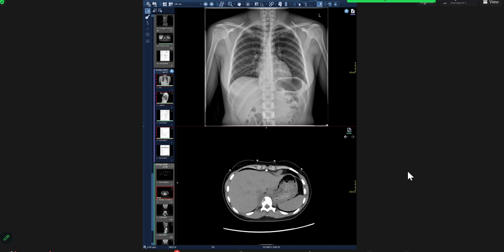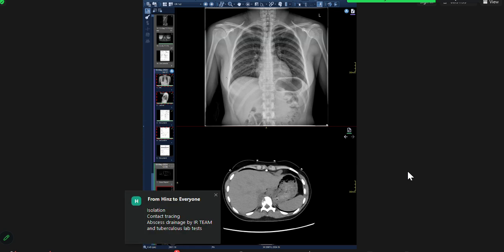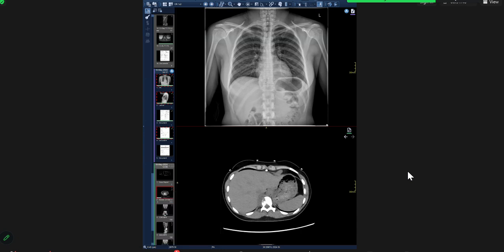And then you said a very, very nice thing, which I liked a lot, that you at once thought about extramedullary hematopoiesis. You told me that the bones look normal, and you're not thinking that it's extramedullary hematopoiesis, which is a very good negative point. That is how you have to treat it. So think about these paravertebral things and what the 3 or 4 major things are going to be.